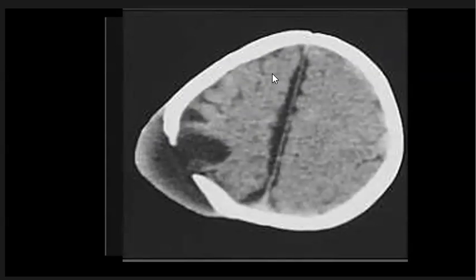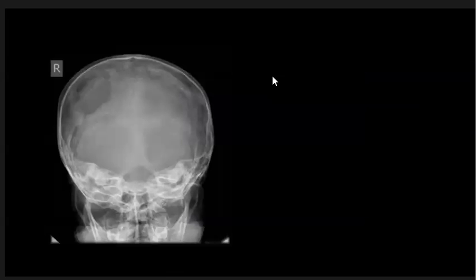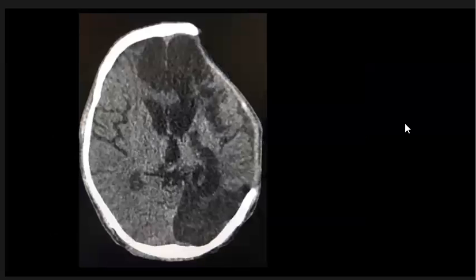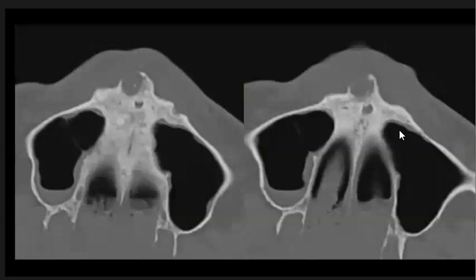The same case. Here a patient with eosinophilic granuloma, as we see here, bony defect in the parietal region. Here we have sinking skin flap syndrome. Here, patient with cystic lesion, and this is periapical cyst.